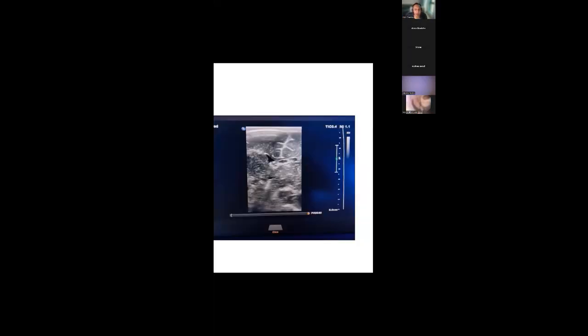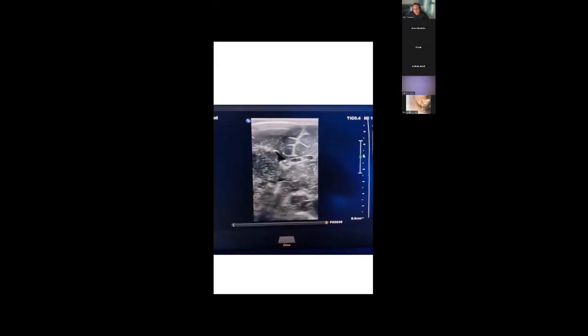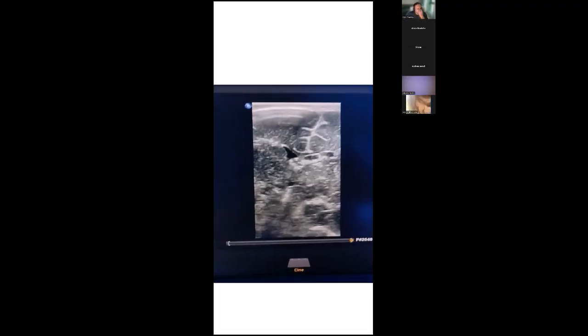It looks like choroid here, but we can see again, I don't know, here it looks like a choroidal cyst. That's a very interesting view because it looks like you've got a septate ventricle. I just think what you've got is a cut of that piece of clot in between. It's not a septate ventricle. My feeling is it's just choroid. I would struggle to call it a connatal cyst at this stage because it's only visible in one view.